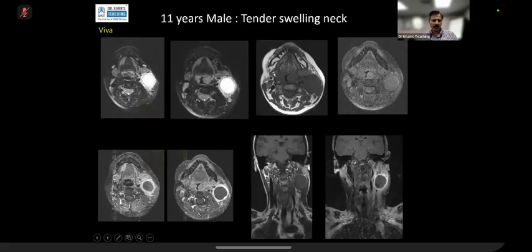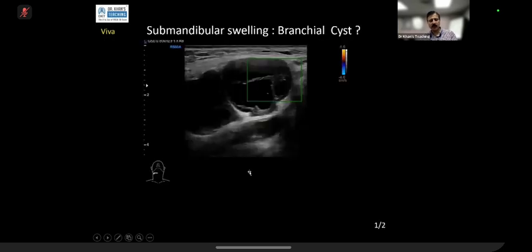And in this case, on the other hand, what has happened to this branchial cleft cyst on this post-contrast image? It's enhancing, it's infected. Yeah, so this is another classical exam case where the second branchial cleft cyst, in its classical location between the submandibular gland and the sternocleidomastoid muscle, is showing enhancement. And please beware of necrotic lymph nodes. I've seen 2-3 cases in my career where it was missed, and that is a big miss, because necrotic lymph nodes will be malignant lymph nodes.